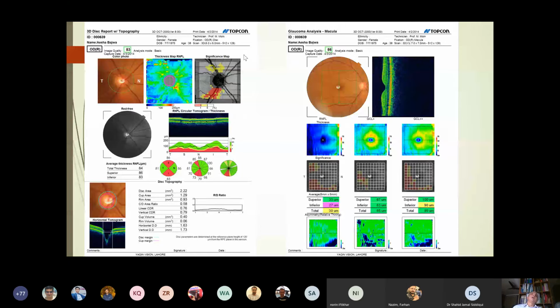That is a patient where you typically want to correlate why this is showing more and the retinal nerve fiber thickness is showing less over here. So this is another patient, a borderline patient, which we're trying to see. Again, let's try to see this.